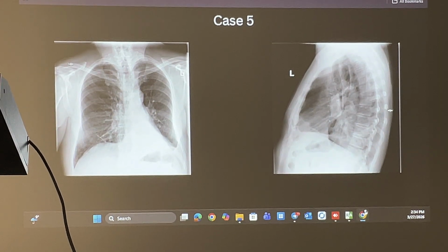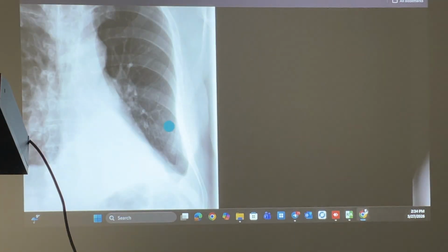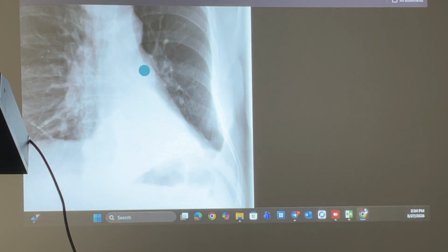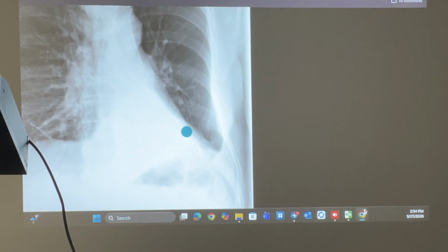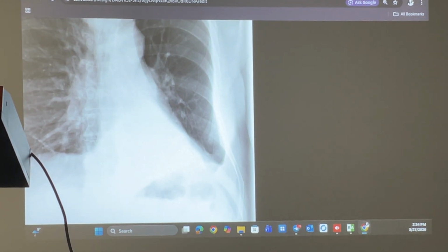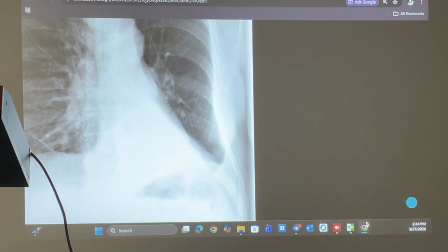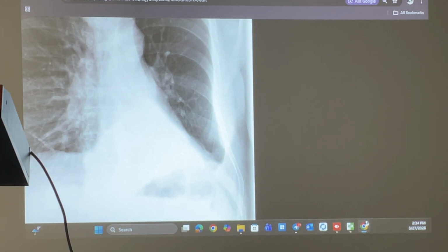and we have gained here a second line. You see this one? Yes. One of them is the heart border, and the other one is the atelectatic lobe's border. So this is called the sail sign, and actually this is the margin of the collapsed left lower lobe.